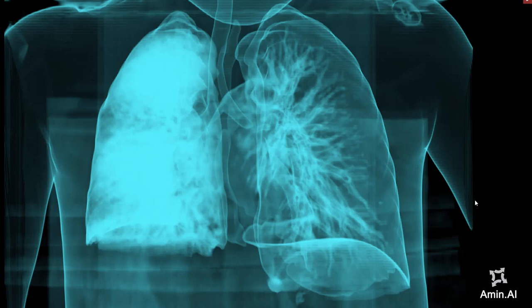This is a rendered image of the same patient, and if you follow this trachea, you can see that there is again a complete obstruction and occlusion at this level of the left mainstem bronchus, where the foreign body is impacted. There is also hyperinflation of the left lung, which in this case is because of the ball valve mechanism, where it permits air trapping by permitting the inflow of air, but no proper outflow of air is possible on this left side, resulting in expansion of the left lung.